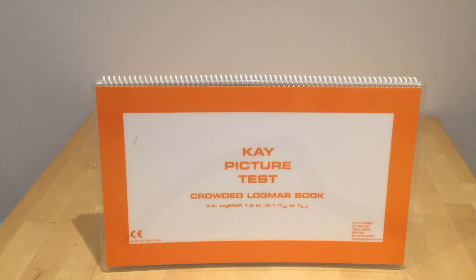They get really confused with all the numbers, what they relate to, and people often come back from being out on visits with lots of post-it notes stuck to the pages so they can come back and figure out what the acuity was that the child managed to get, and ask for lots of advice from different colleagues. So I hope to clear it up just now.